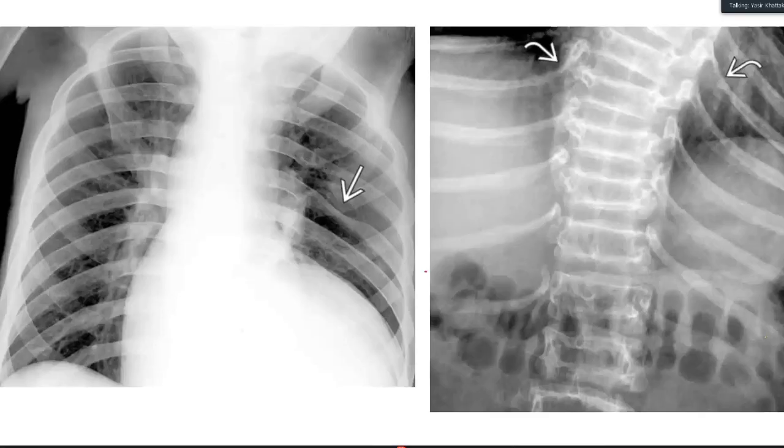Another case of rib notching, you see this one, it's a unilateral superior rib notching, right? And I'll give you the history, the patient is quadriplegic. So this one is because of position. The scapula is pressing for a very long time on the adjacent rib, and because of muscular atrophy and osteopenia, a patient can have this notching.